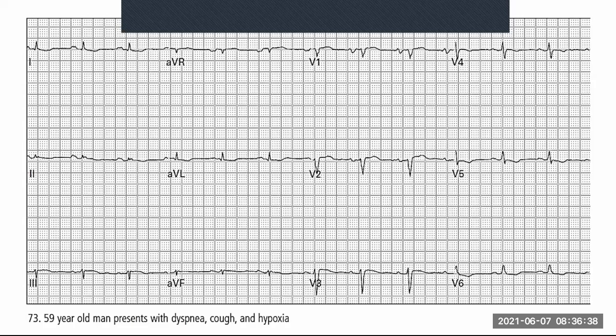Okay, so let's start with the inferior zone. What do we see? Anything abnormal? Does it look okay? Does it look like what you used to see? That's the first thing. Not really. What looks odd about it? That's what you've got to ask yourself.